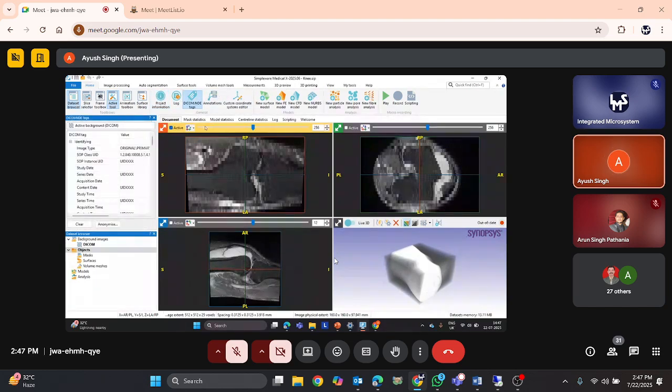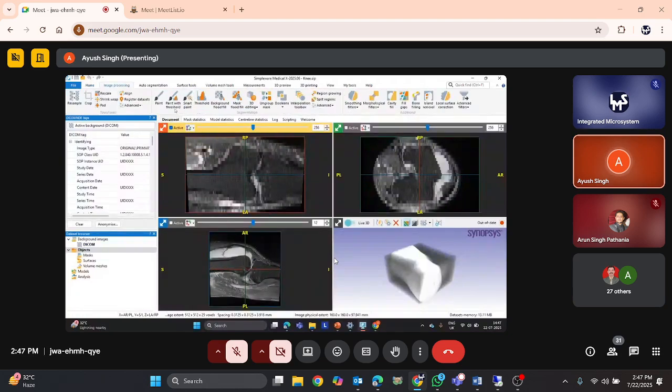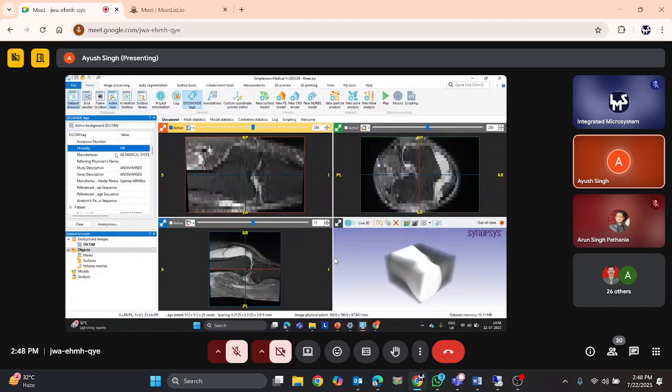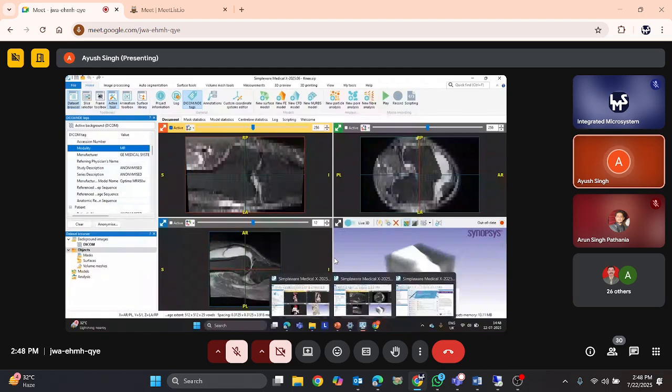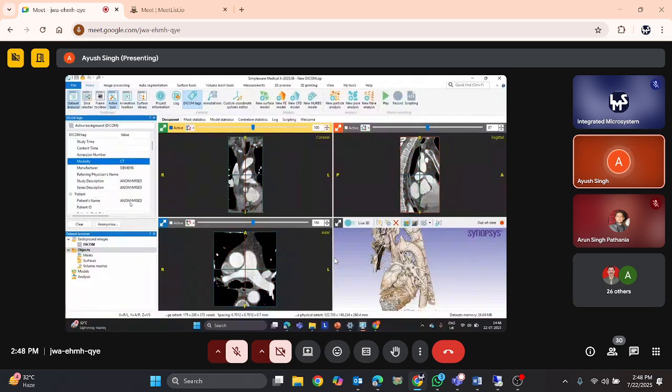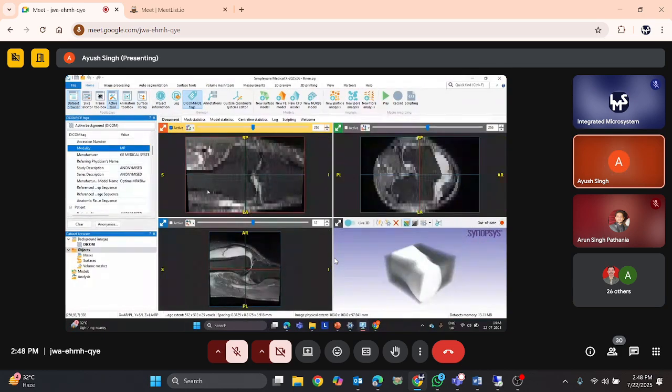First of all, when we go to the DICOM text option, in the home, we'll click on DICOM data text, and we can see this is an MR dataset, which is a magnetic resonance imaging dataset. The earlier dataset that we were working on, this heart, was a CT dataset, which we can check from here, DICOM dataset CT. And the positioning and the view naming is different from CT to MRI, so that is also another way that we can identify the different views.